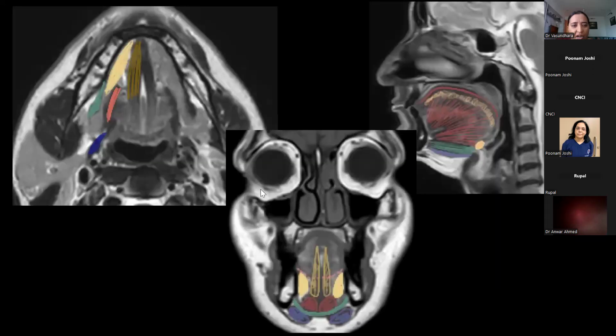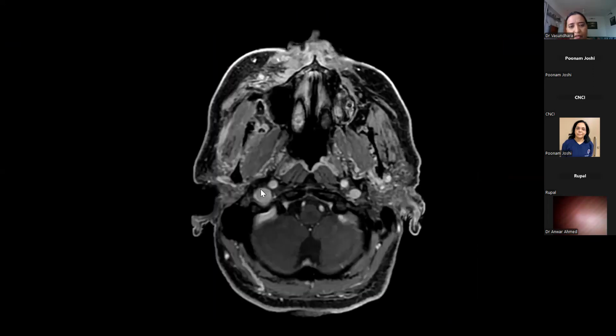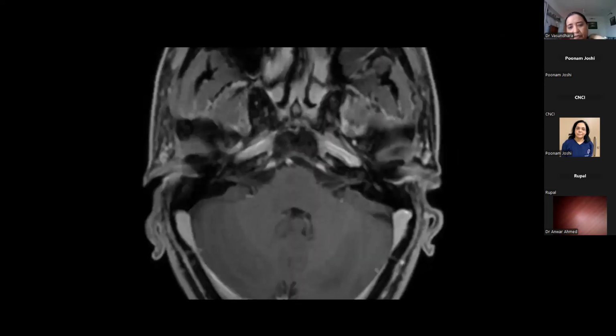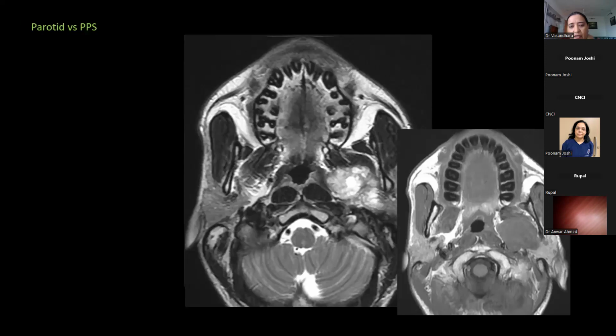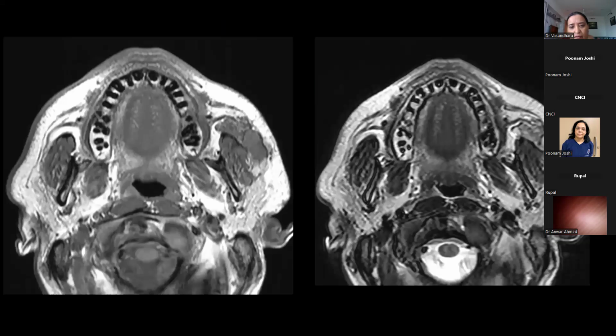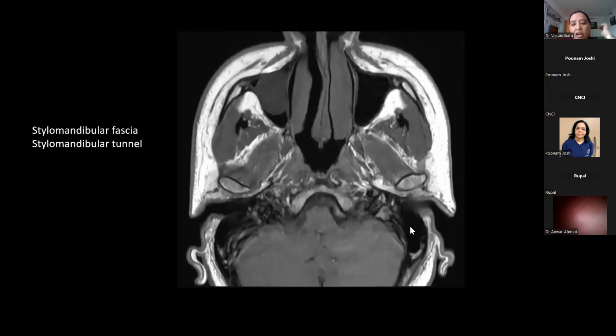So facial nerve outside the canal, how do we see it? Now, how do you go about? You come up to the EAC, start tracing your mastoid.